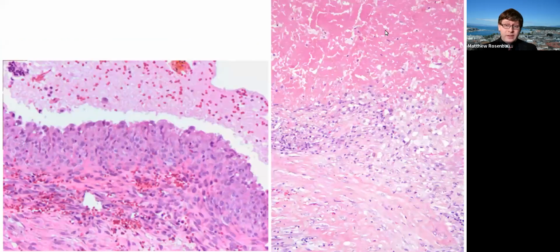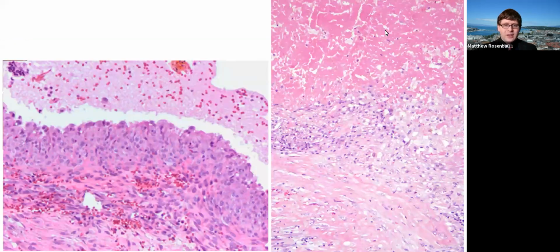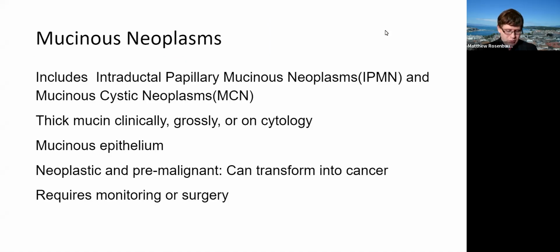If you see this and it fits very well with the clinical findings, you can basically say this is benign, non-neoplastic, because everything fits well together, with the acknowledgement that there could be something else you're just not seeing. That's always a possibility with cytology. Sometimes these do get resected due to causing symptoms or other concerns. Here are some good examples: the histiocytic lining on the left, and more debris on the right.